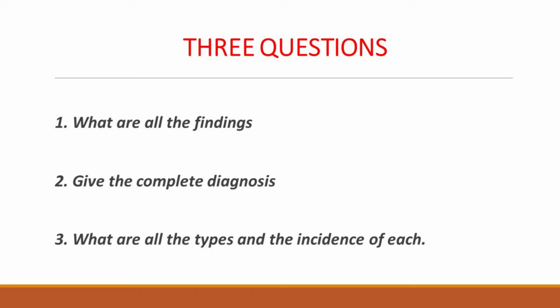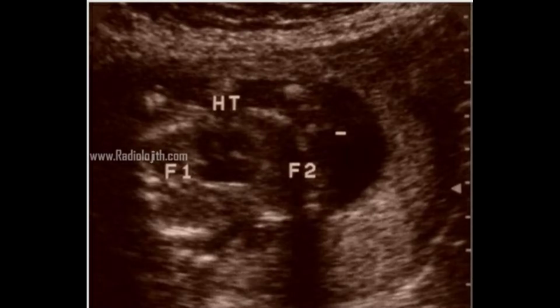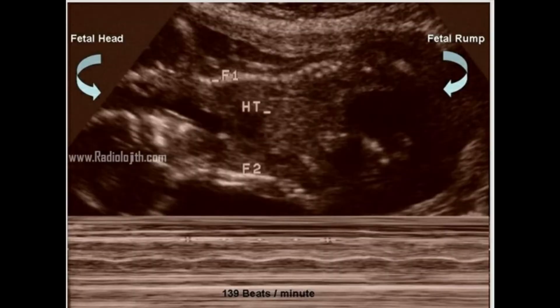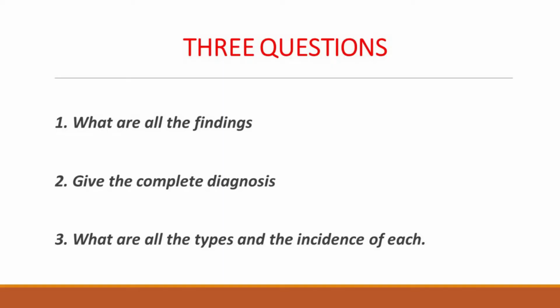The sonographic images are at least 15 years back. They do not look majestic, but the images are still very diagnostic. If you want more time for the diagnosis, pause the video and go back to assess the images. Within few seconds, I'll give you the findings in the complete diagnosis and then go for the discussion. Are you ready? Let's go.